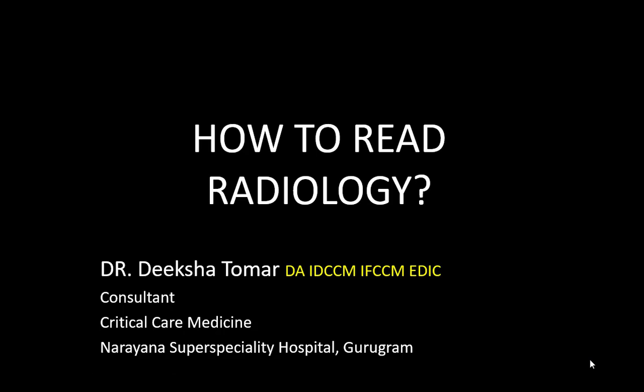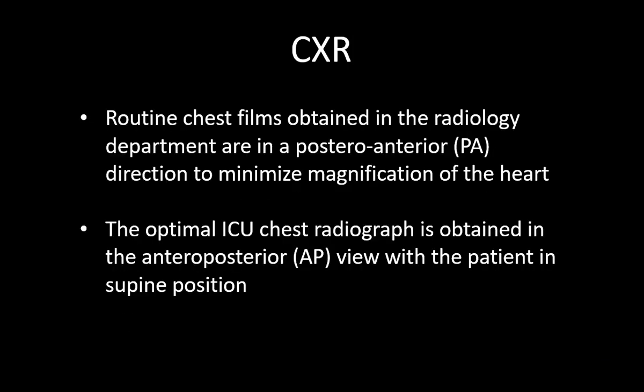Good morning. So, how to read radiology in ICU? This lecture is going to be a discussion on commonly used radiology which we come across in our ICUs and which can be asked in various examinations. We'll start with chest X-ray.